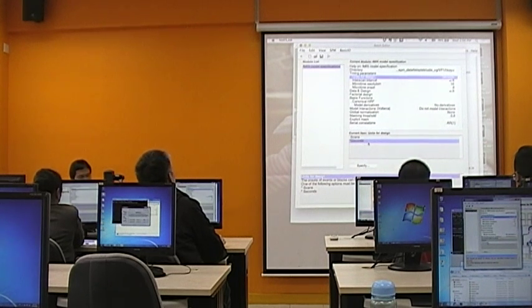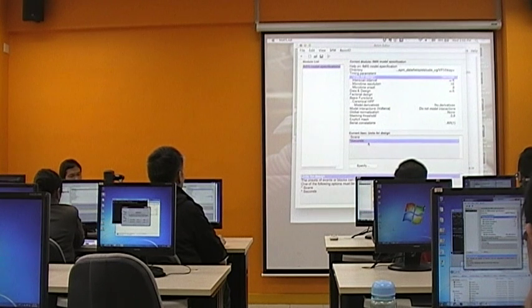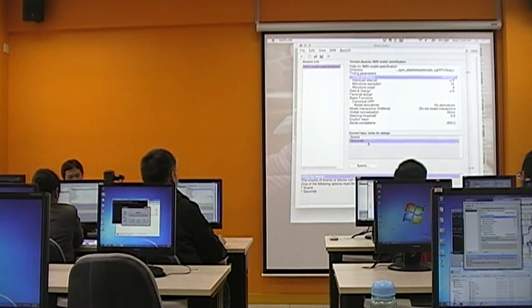And you could have decimal numbers. You don't necessarily need to put in integers for the event onset. So I could have my first trial starting at 1.69 scans. Okay? So it doesn't really matter if you choose scans as the unit.